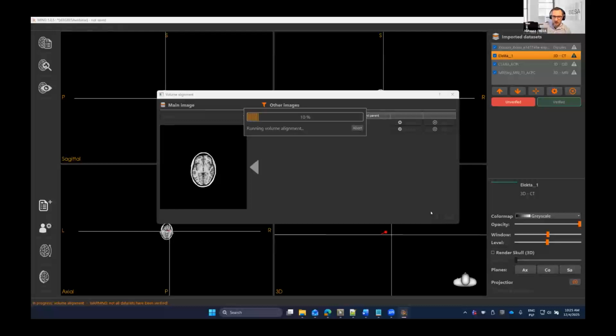In this particular case, our CT data is not the highest quality. You will see it's full of artifacts, so the automatic assignment does not work in some cases, but we can also use the computer-aided approach to mark the electrodes, and this is a fairly easy and fast procedure. I will show you how to do it, and then we can prepare it.